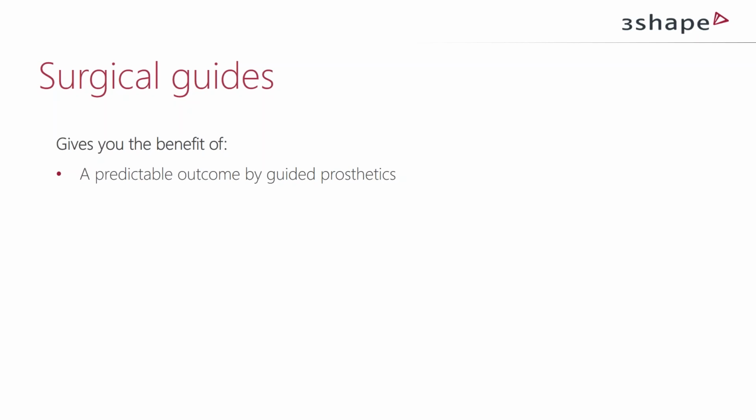So surgical guide design, the quality of the guide is a key element of success of this kind of principle. And everything with digital accuracy, not the least. We have and will get the benefit of the option to make a customized healing abutment. This can be used to restore the emergence profile or even to make a temporary crown or abutment.